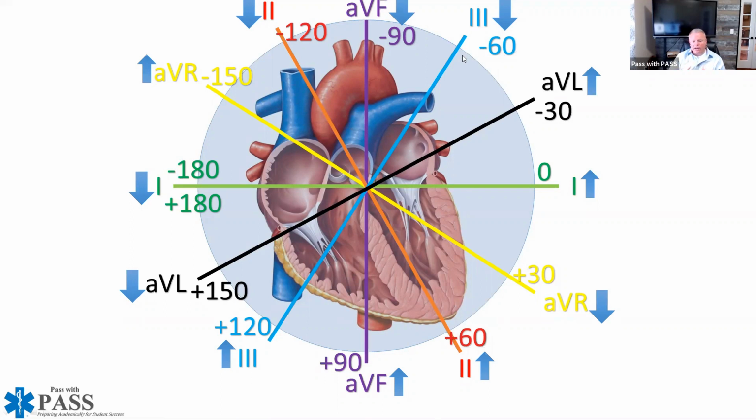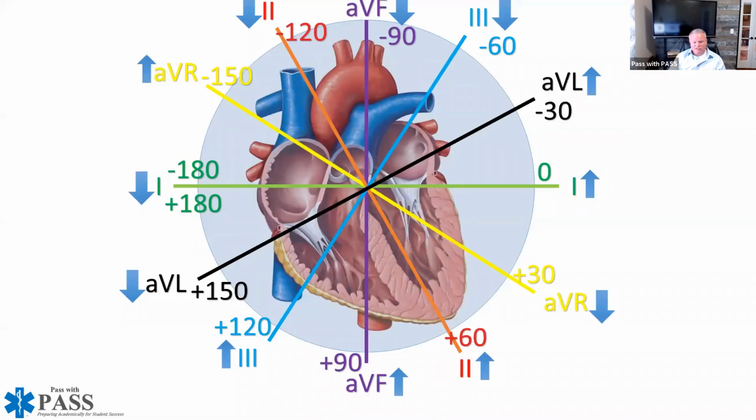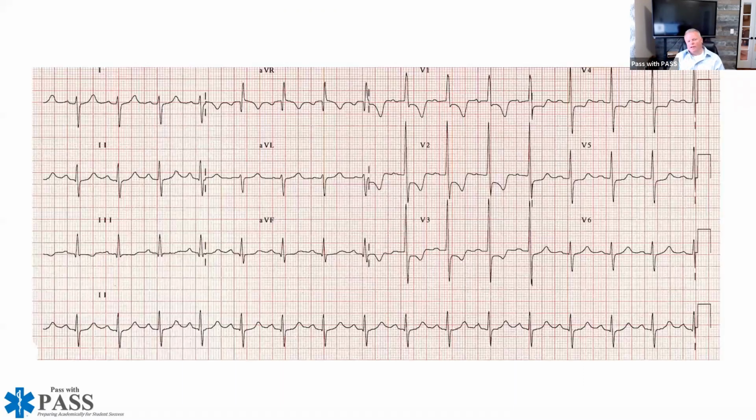So I told you guys that it was left based on the thumbs, but this is actually a pathologic left. So there's something going on with your patient here, pathologic left. So they're outside of the normal range. Negative 60, left upper quadrant. It is a pathologic left. So this is what we started off with.